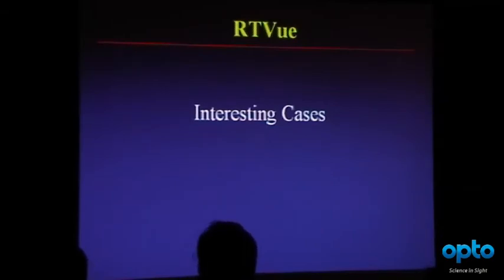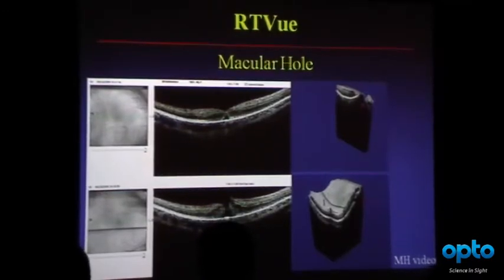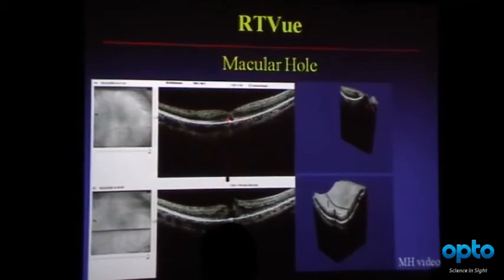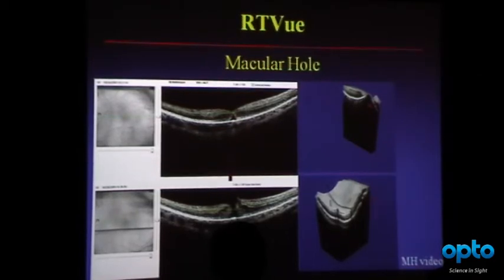In the interest of time, I'm really only going to show you a couple of cases. Before and after macular hole. Bottom is before, top is after. And notice, as we often see, there's a little bit of fluid still.